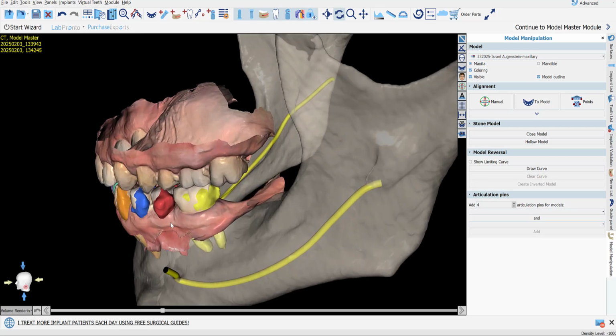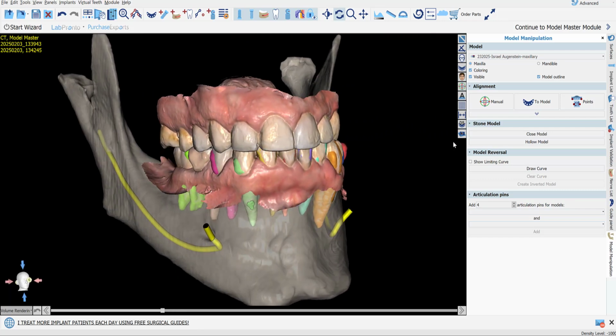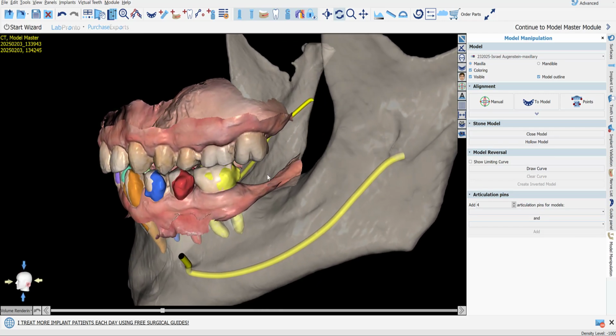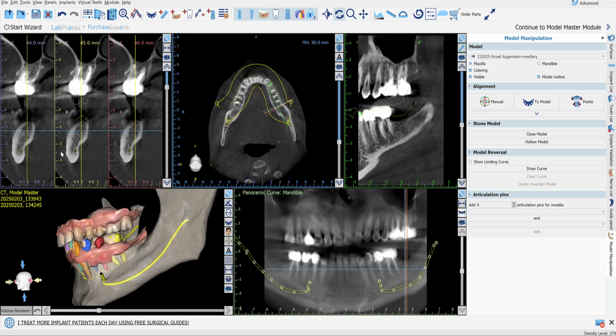Just want to show you the ease in planning a Blue Sky plan. So, I have a patient with a very straightforward second molar needs replacement. Bone levels are a little bit complex. We've got a submandibular fossa here. We've got the bone kind of dying in a little bit on the buccal. So, I want to make sure to nail this.